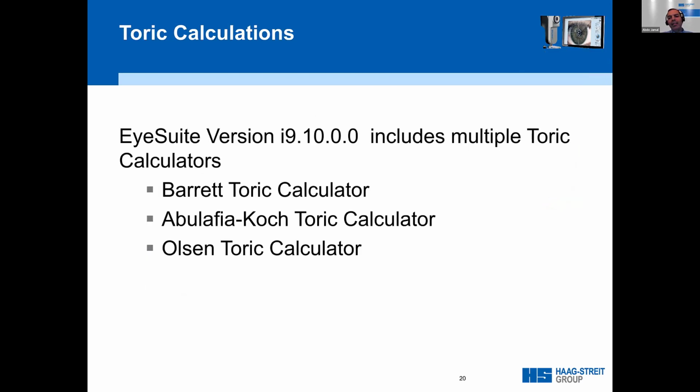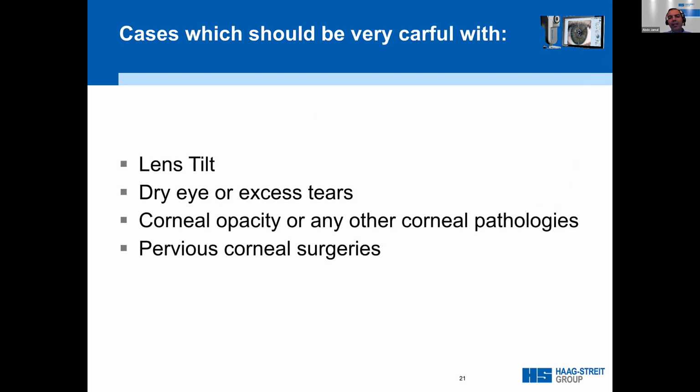For toric cases, EyeSuite provides state-of-the-art toric IOL calculation. Before we dive into Lenstar Toric Suite, please be careful when selecting toric patients. We should be very careful with lens tilt, dry eye or excess tears, corneal opacity or any other corneal pathology, previous corneal surgeries. More investigations should be considered before taking a toric implantation decision for such cases.